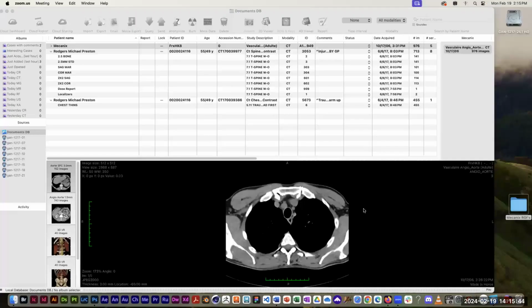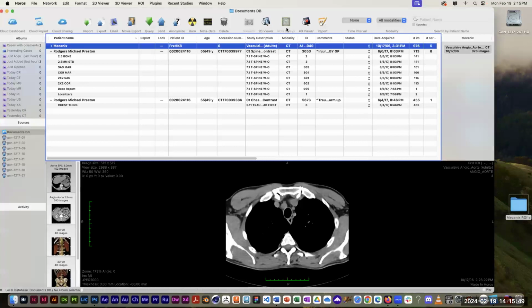The second part, which is going to take longer and is going to involve an exercise on your part, is about segmentation. And I'll explain that too when we get to that point. So first of all, slice interval. I'm going to, let's see, I better share my screen here. Right.